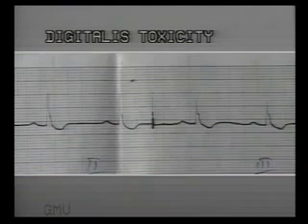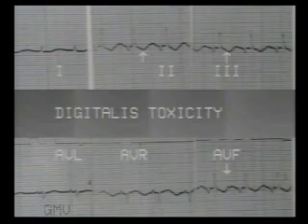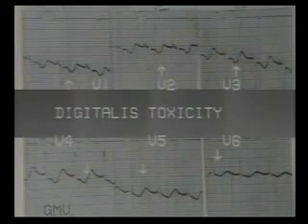With further toxicity, the T wave becomes flat or inverted and various cardiac arrhythmias may appear, commonest being ventricular extrasystoles, ventricular bigeminy, progressing to ventricular tachycardia. Also remember that the ST depressions of digitalis toxicity are seen in many leads, anterior as well as posterior and chest leads.